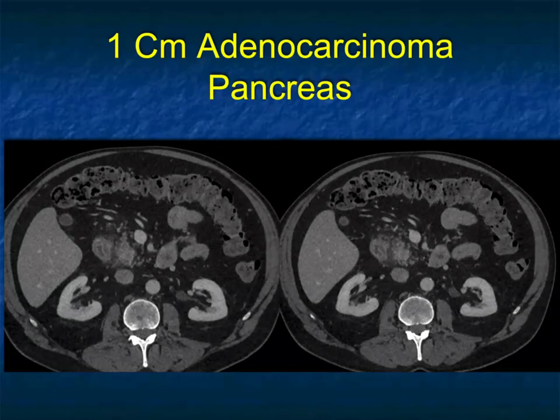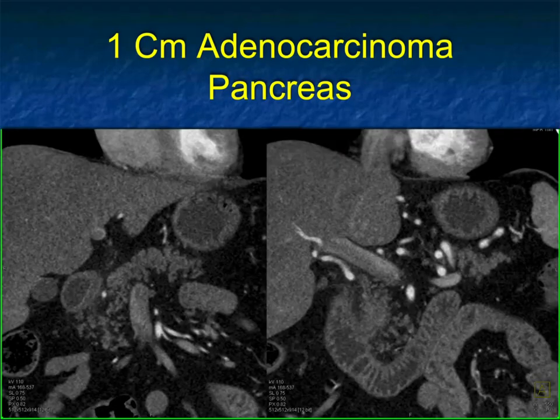Another case, here's a patient where it looks almost like pancreatitis stranding by the head of the pancreas. But then if you look carefully, there's a mass in the uncinate. That mass is all of 1 centimeter. The rest of the gland, the body and tail, look terrific, but it's this uncinate lesion. Remember, I told you one of the most common areas to miss tumors is in the uncinate. You don't have a dilated duct. You may not see vascular involvement, but these patients would be very resectable.